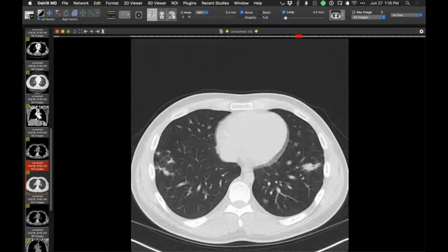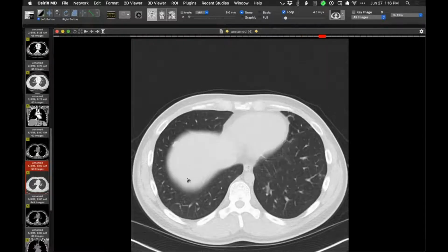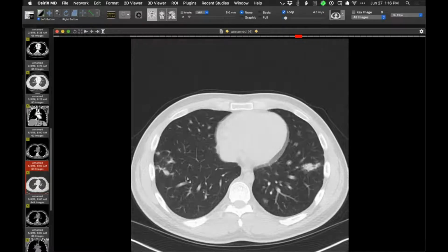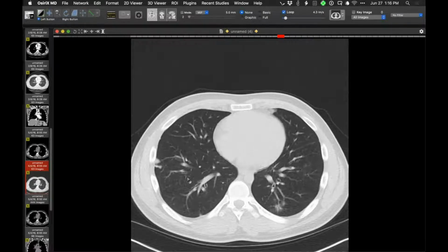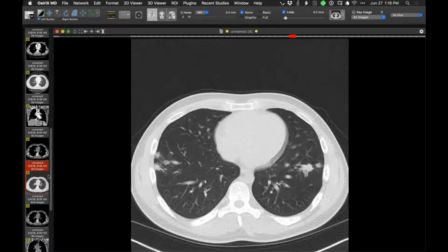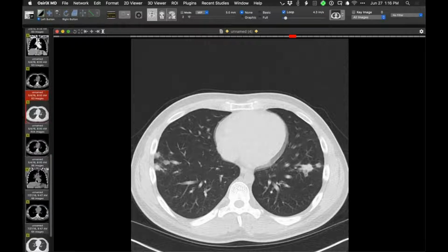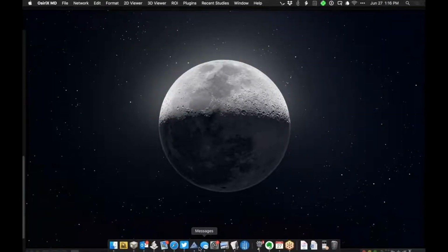Some of the lesions have patent airways going through them, but in terms of suggesting a diagnosis, I would be very comfortable ascribing opacities like this to GL-ILD. And let's see if I'm right, because this person had a follow-up without treatment. So that was, sorry about that, I'll bring it up.